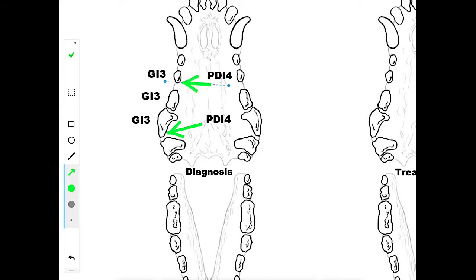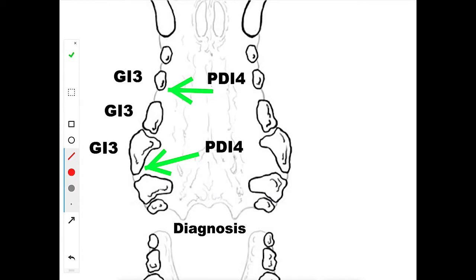Move it like this, and there you have it. So we also had a little mass adjacent to the third premolar, so we can draw that in if you like. So go back up to the little pencil marker, and you can change the font size of your symbol this way. So we'll go down to about a 2 point, and then we'll enlarge that a little bit, and we'll create a little mass here.